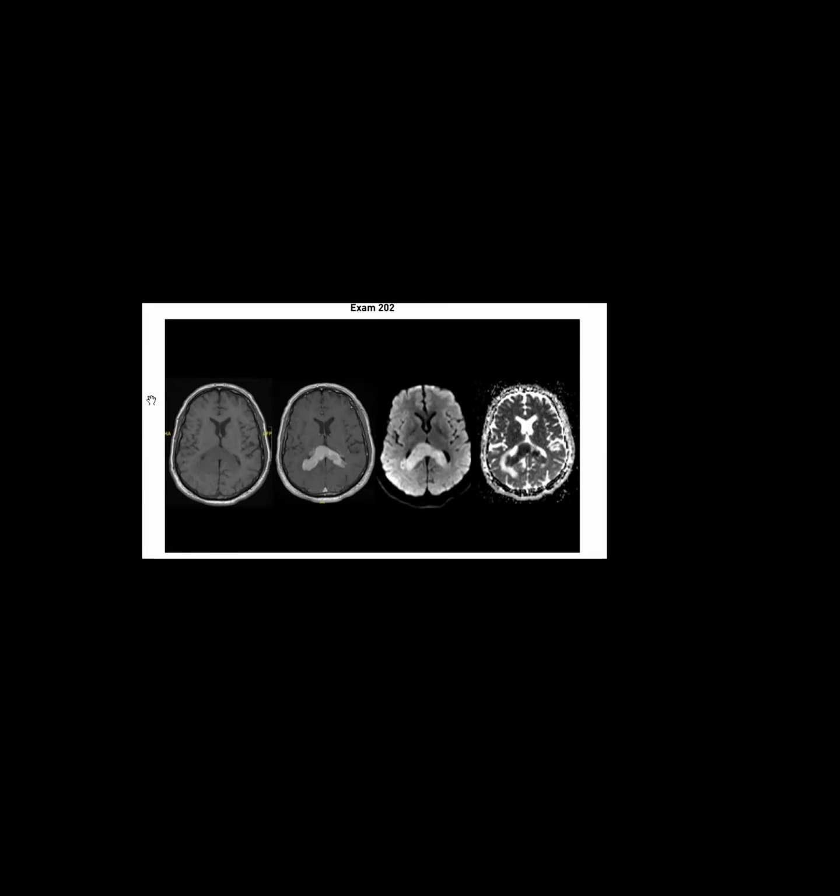In the first picture here is the T1 sequence. We see isodense things in the posterior horn of the ventricles, and then the next image looks to be T1 post, which seems to be enhancing things going on over there.